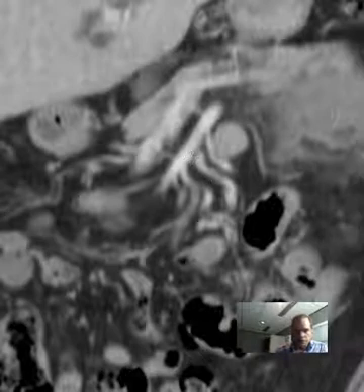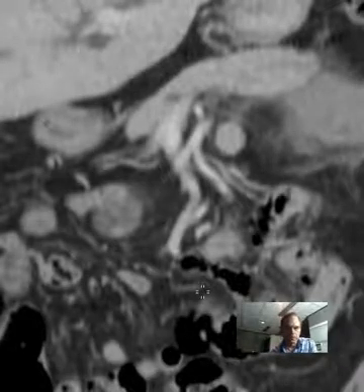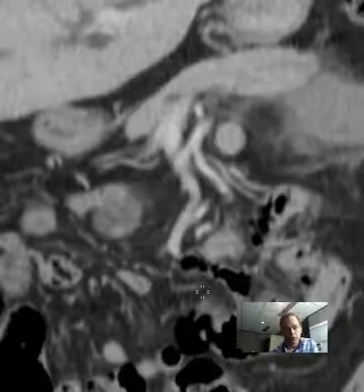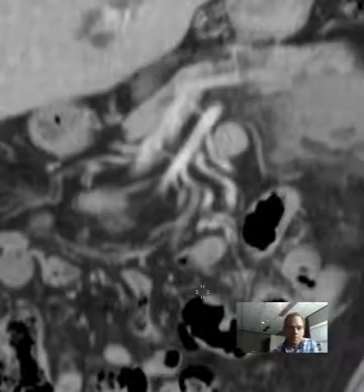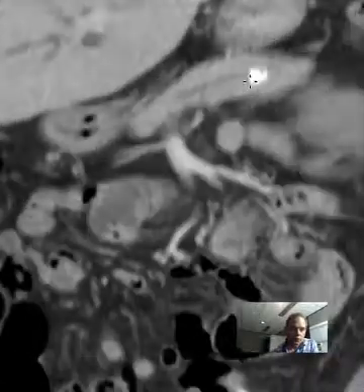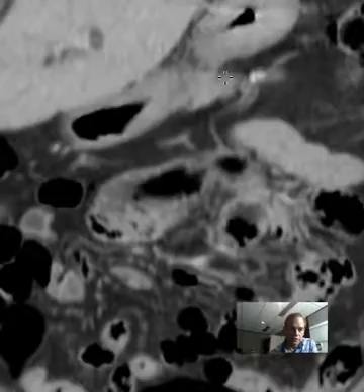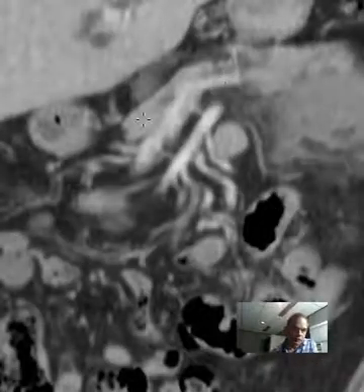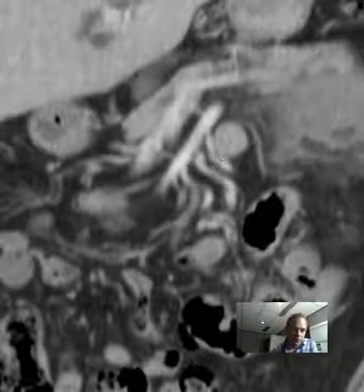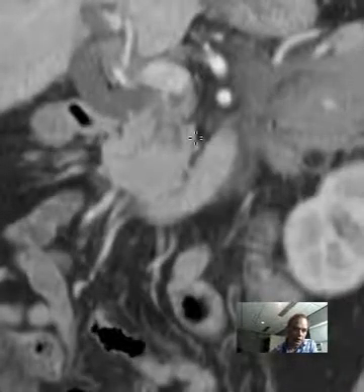And you see these arterial branches going out in the mesentery, the fatty material that is the base of attachment for all of the, or most of the small bowel. Okay, and what do we have here? That should be pancreas. Yeah, this is body of the pancreas. Have a calcification there. And let's see, if we follow it right here, it should get embraced by the C-loop of the duodenum, and indeed it does.